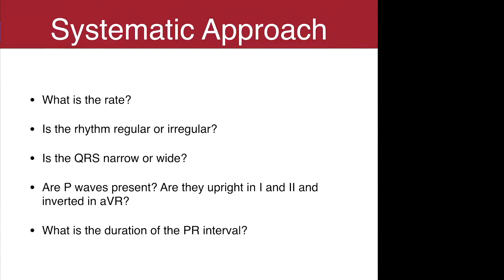and it's really the only way to get an accurate rate with an irregular rhythm. So you have to count out 6 seconds. Now, I know the workbook is not perfect. Maybe there's only 5 seconds on there. Well, guess what? You can figure out a rate with 5 seconds. Instead of multiplying by 10, you'd multiply by 12, just doing the math to figure out what it would add up to in a minute. And that's really what we're trying to figure out.